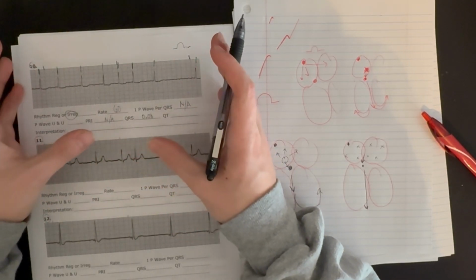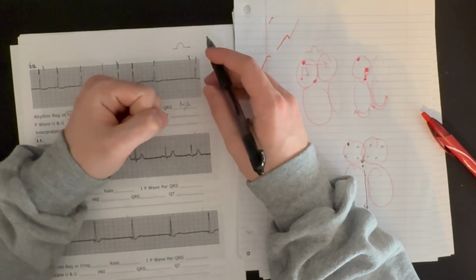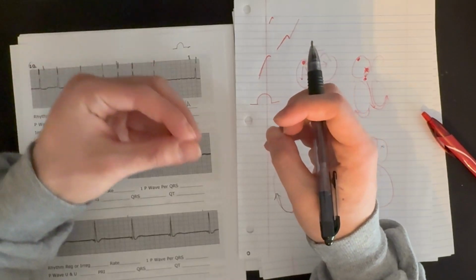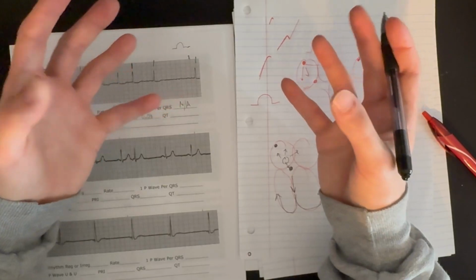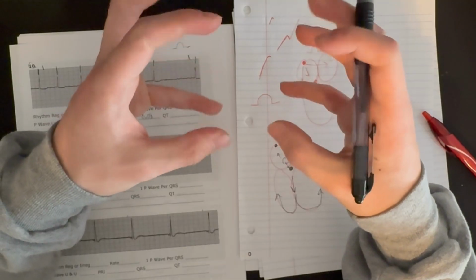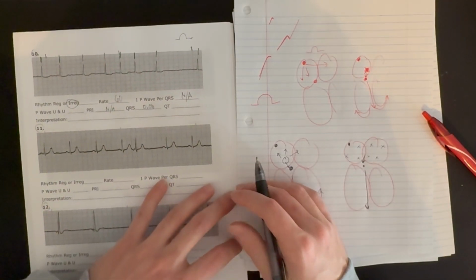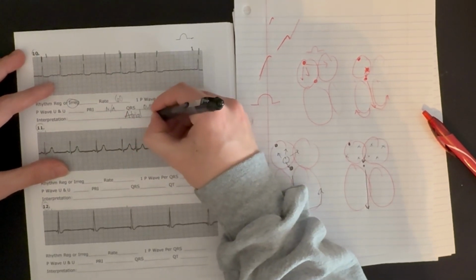There's no consistent timing. There's not a single place in the atria that is creating an impulse that is causing the entire atria to depolarize at once, and then for that impulse to get to the AV node and then down to the ventricles. So it's basically a case of, man, we're just going to be sitting here contracting and depolarizing poorly until finally one gets down and the ventricles get it and they can contract. And so that's why it is irregular. So this is atrial fibrillation.